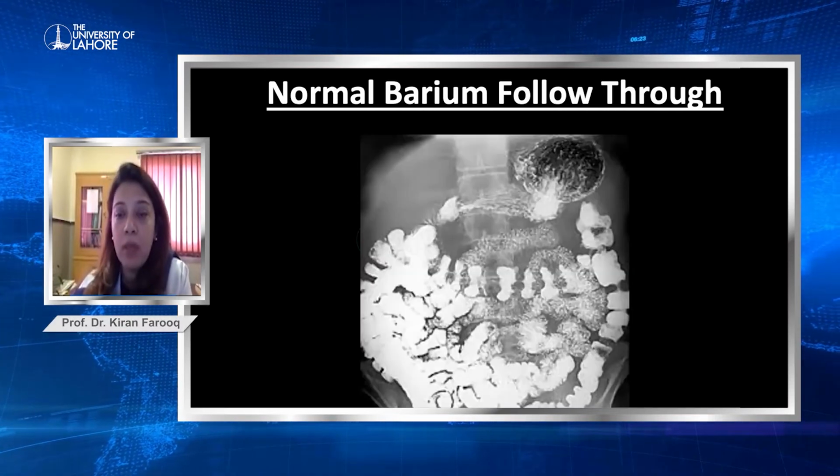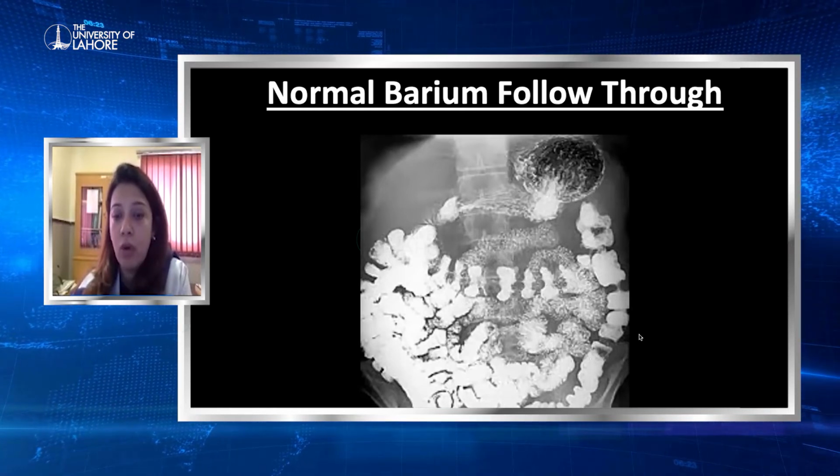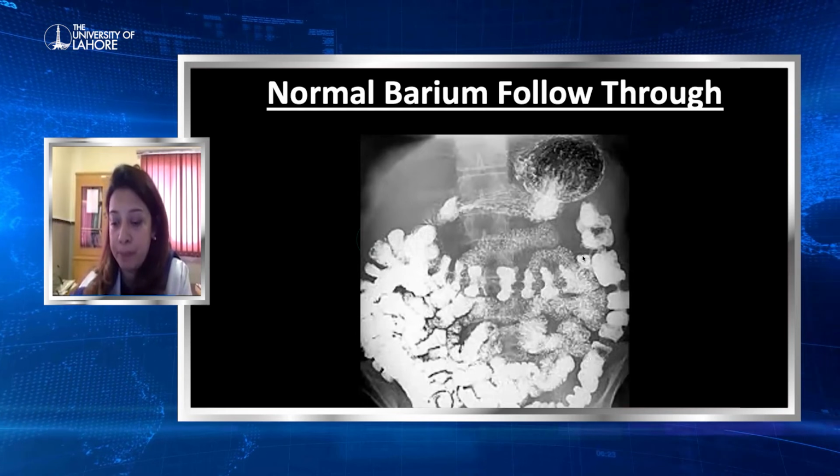Another normal barium follow-through examination, but here the contrast has gone into the colon as well. So it's a very late film.